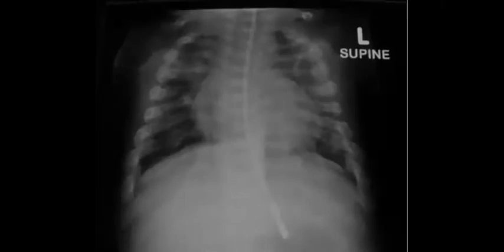And I see in the comments, appearance of the ribs, I agree with you. And it looks thickened or broadened, I agree with you. And the lungs look a bit normal, no pneumothorax. And before everything, you should comment on the nasogastric tube, and it is in situ. So you should start with the tubes and the lines. And the tip looks below the diaphragm in good position, so it is in situ.